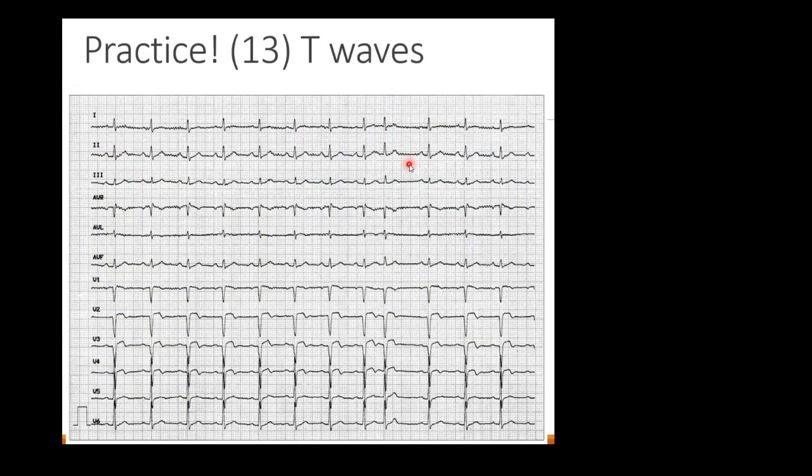Now, here's a practice question. It is question number 13 from the ECG booklet, and I recommend focusing on T waves. So just pause for a minute and give it a try.